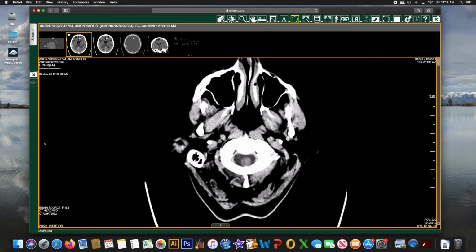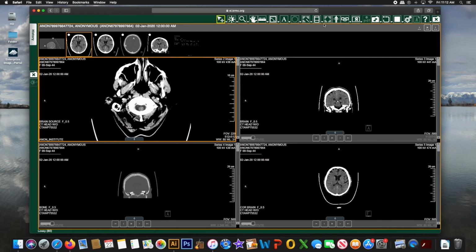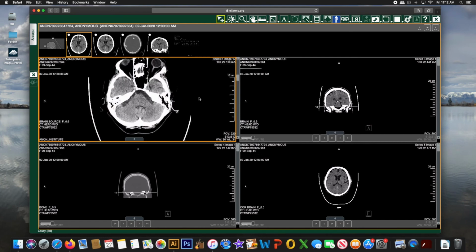The localizer tool is the next one we will discuss. It can only be viewed in multiplanar imaging and when more than one image pane is open in the layout. It's used as a reference point in the anatomy of another plane when scrolling through the primary image. Notice the localizer line moving as the image is scrolled.